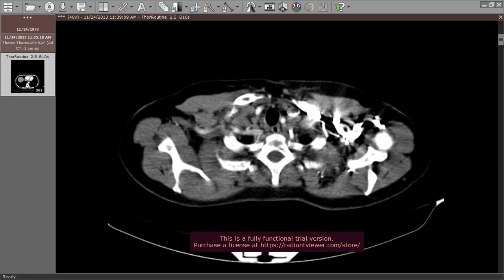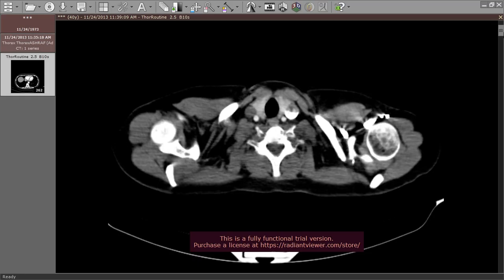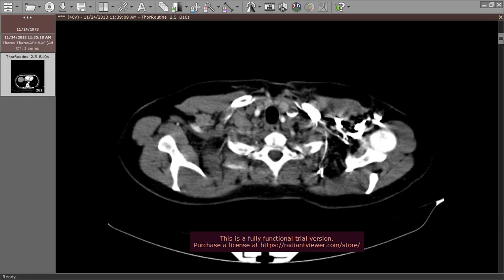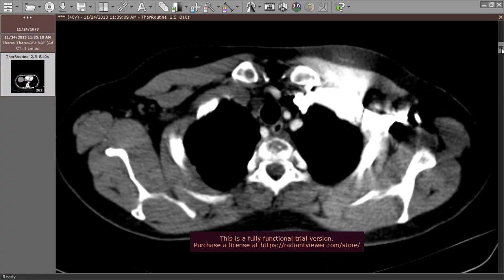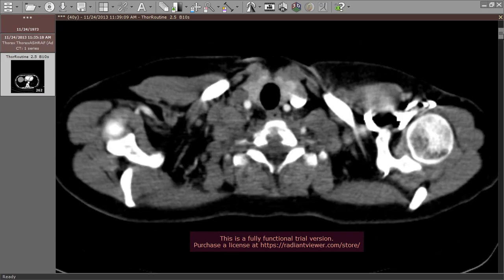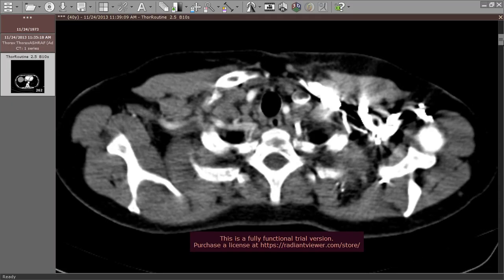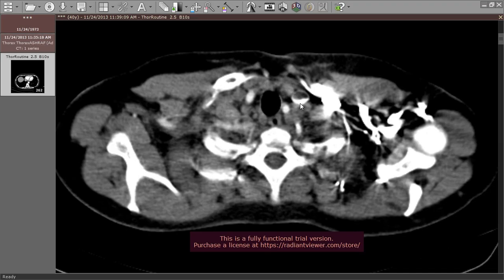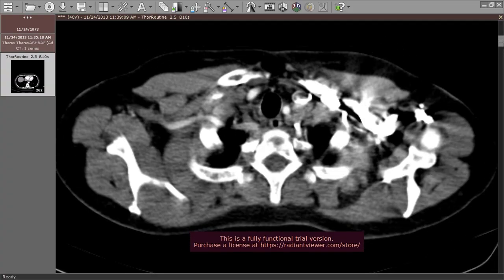You have to go up to the level of the supraclavicular region, because this is a site of pathological lymphadenopathy as well, and it is also a cause of non-regional metastatic lymphadenopathy, M1. You can see this lesion. There is soft tissue fullness here, which is encasing the vessel. This is actually a pathological left supraclavicular node. The prevascular region and the aortopulmonary region are clear.